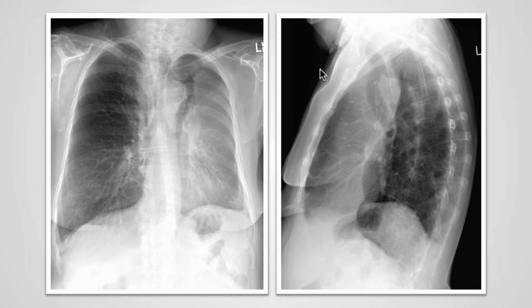within the lung. Here's another example of left upper lobe collapse. On the lateral X-ray, we again identify the opacity of the collapsed left upper lobe and the edge of the oblique fissure. In this case, however, we can identify a lucency superior to the opacity within the left lung.